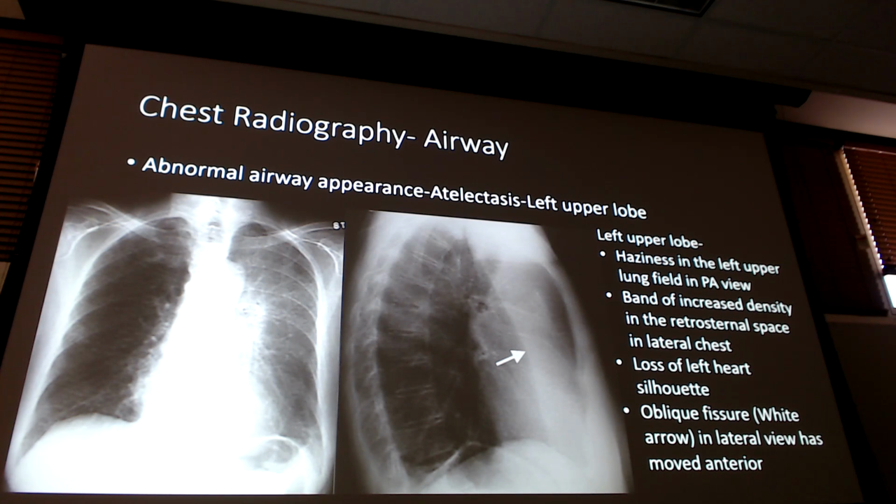So what happened is the upper lobe, you got a whole upper lobe atelectasis, it collapsed on itself, and then the lower lobe in the chest was like, whoa, there's space there to fill. Hyperinflate, fill up more to fill up that space. And that's why it's way more radiolucent and way more dark than normal, because typically this tissue is condensed down here for lower lobe stuff, but it's not, it's expanded out, so it's thinned out and it's kind of opened up. Good? Okay. Yeah, of course.